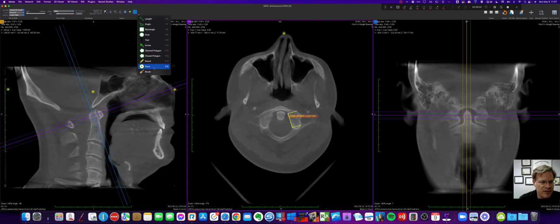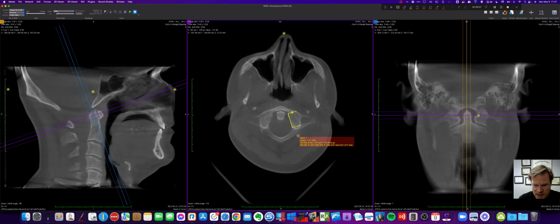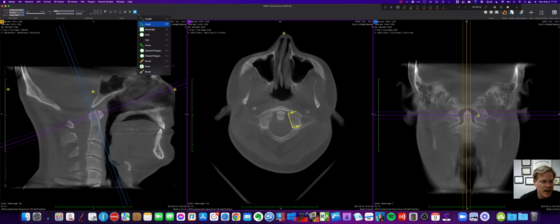Remember I said how things move if we move things around. So I'm going to bisect that line and that line with these permanent points. And that's going to be my convergence angle. I'll measure it in a moment, but let's go back here and do the same thing.